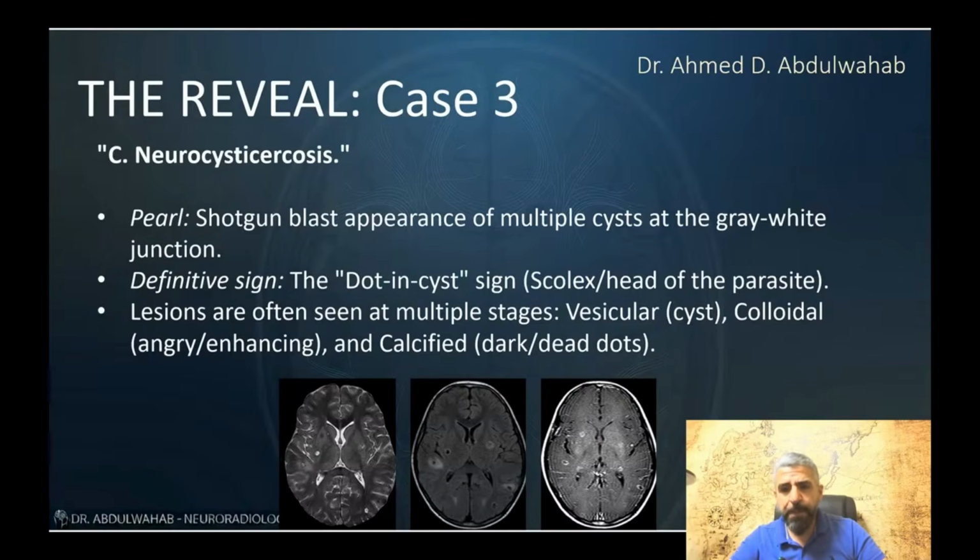Parasitic infection by the pork tapeworm. Detectives, this shotgun blast of multifocal lesions is a classic pattern. Why not metastasis? Metastasis rarely has a scolex or dot inside and usually has much more edema. This pattern is just too distinct.